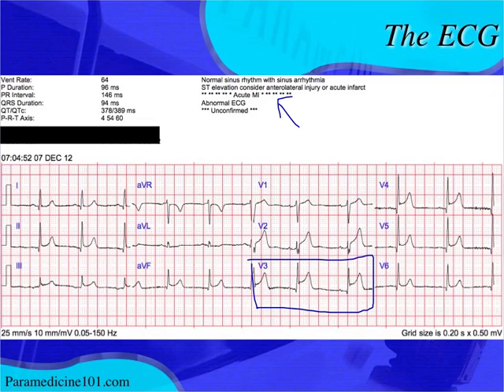These T waves are all tall, and they are symmetrical. Now, it's hard to tell that they're symmetrical, but you have to almost draw a line down and finish off that T wave. And then if you drew a line down the middle, you'd see it does mirror itself on the left and right. So they are symmetrical T waves with a broader base. I wouldn't say that they're hyperacute looking, but they're not really the big, tall, huge hyperacute T waves that we're used to seeing.